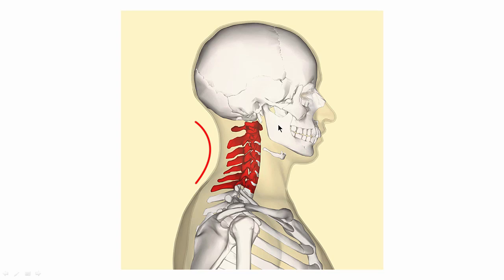Remember the parts of the mandible. There was the ramus of the mandible, this downward projection of bone, and it meets the body of the mandible at the angle of the mandible, the spot where they meet. Condylar process of the mandible would be here. That forms the TMJ joint, the mandibular fossa, connects into the squamous part of the temporal bone, and then the coronoid process. Yes, another coronoid process of the mandible would be up here.